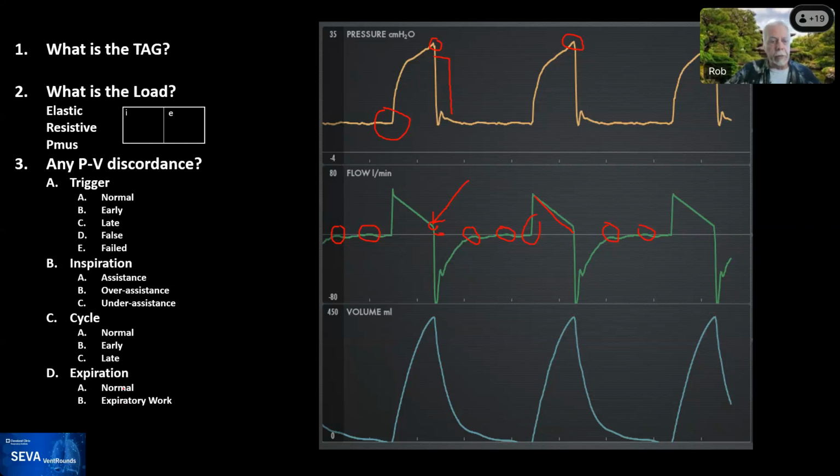And in the expiration, this is where we see no evidence of an inspiratory or expiratory effort. You see the short time constant, the fast expiratory flow decay back towards the 0. But we see these little perturbations, which someone pointed out might be cardiac oscillations. Sometimes cardiac oscillations can cause a problem, right? Because they can cause a false trigger signal. But in this case, what could we do to distinguish what's going on here a little bit better? Anybody have any idea? What maneuver could you do at the bedside to help us out?